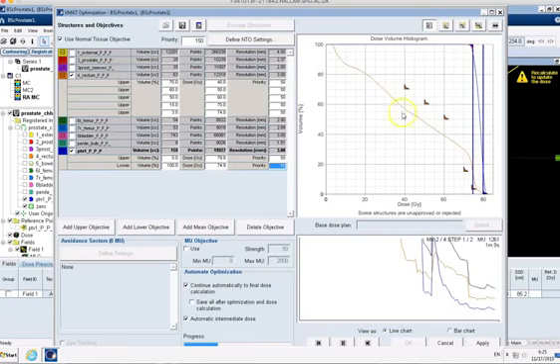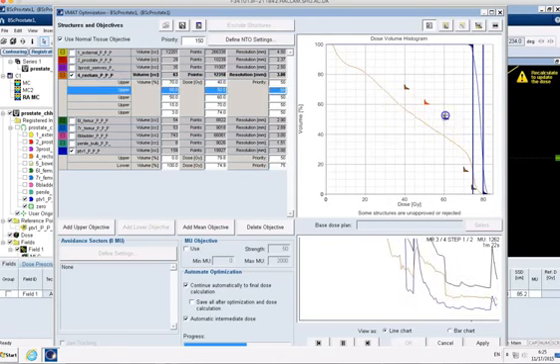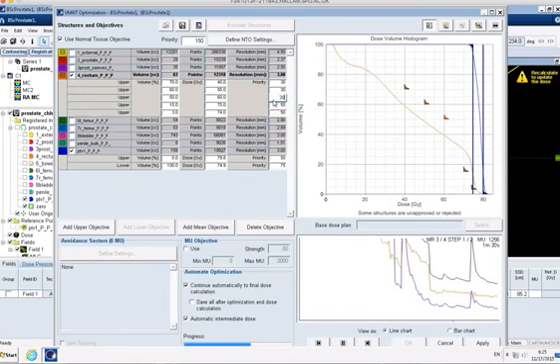Okay, so we can see here that it's really easily meeting these constraints, but it's not meeting these constraints here. So we can see that it's going below the line there, below the dots there, but over the dots there. So that tells me we're overdosing here. So what I could do is say, actually, you're meeting these three really easily. So let's make these a little bit less important. Let's not worry about them. Let's reduce how important they are, because you're meeting that quite easily.